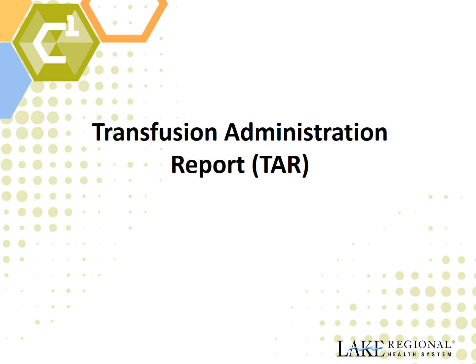Transfusion Administration Report, also known as TAR, is utilized to capture and document the transfusion of all blood products being administered. You will still need to present the transfusion request form when you go to the blood bank. However, the product will be issued without the carbon slips, as all of the information is captured with TAR. So therefore, blood bank will not be issuing the blood transfusion slips anymore. TAR replaces the manual paper process for both issuing blood products and capturing the report data on the lab side.